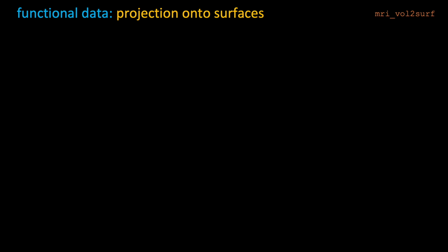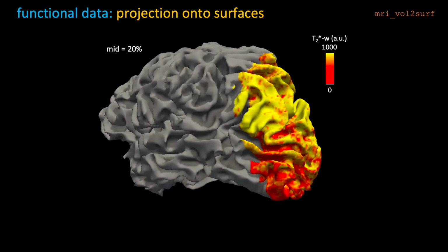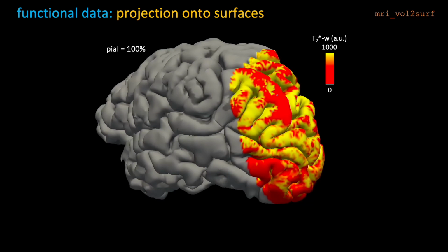And here is how the projection of the data on the surfaces actually looks. This is an overlay on the white matter surface. This is actual fMRI data. It's just a weird color map, but these are actual fMRI data values. And the mid depth of 20%, 40%, 60%, 80%, and finally 100%, so that's the pial surface.